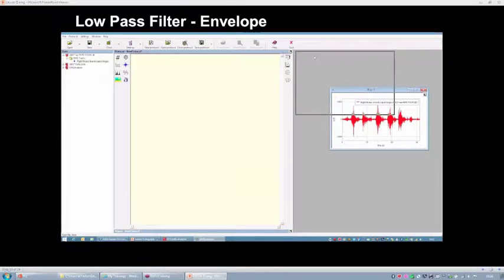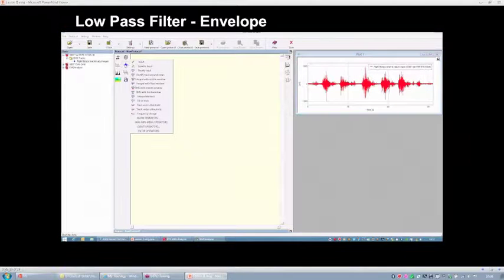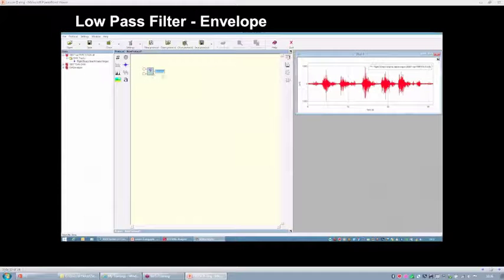So now I want to show you an example about how to do that. So this is the signal, and now I'm going to compute the envelope of this signal by means of the application of a low-pass filter. I'm going to use one filter, so the Butterworth low-pass filter, for example. Okay, remember that you have to type the name of the output.